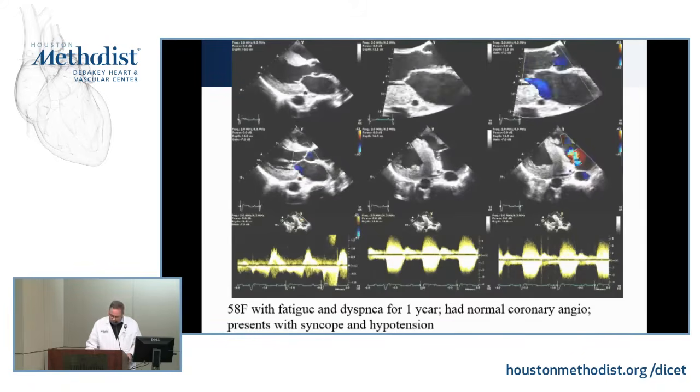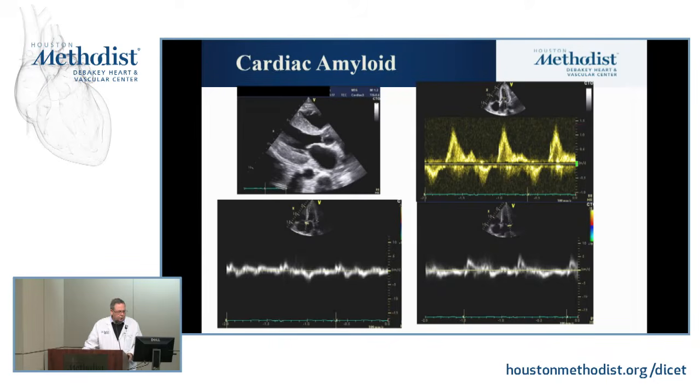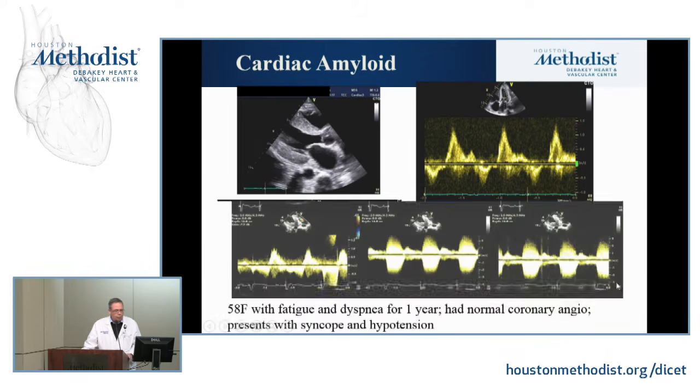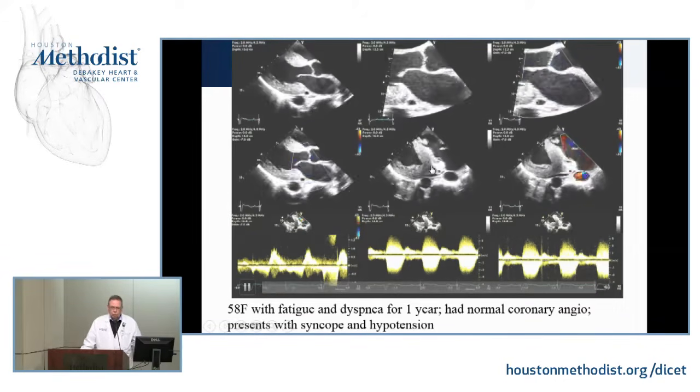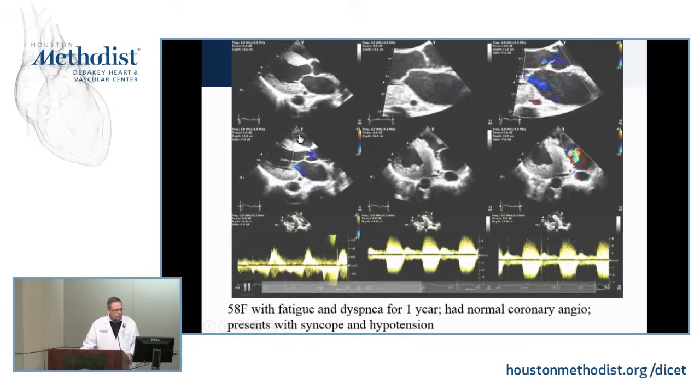This is an example. This particular patient already had at least type 2, if not type 3, abnormalities of diastole. Look at the tissue Doppler, extremely low value. So this patient was already at a more advanced level, and this patient was moribund. I'll show you several levels.